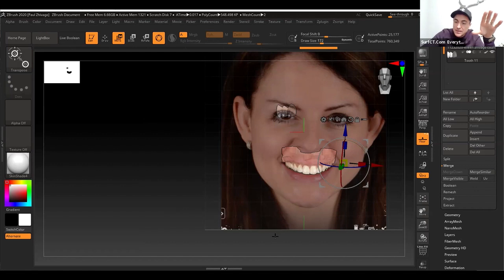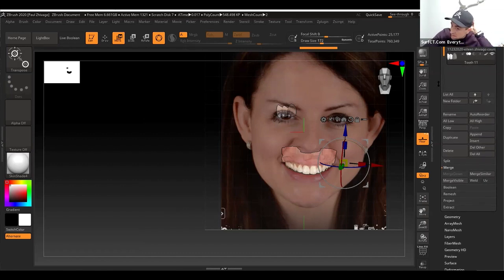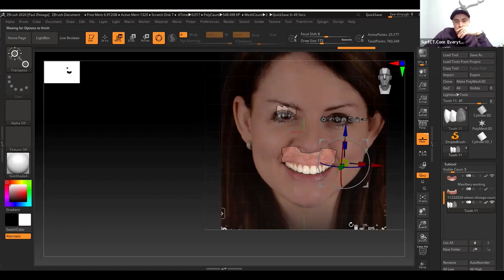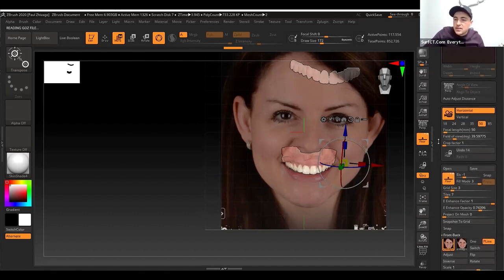So that's another workflow. And let me just import the whole arch here, because I already put them together and connected it as an arch. Let me just do this. Let me see where they are. So it asks me again the same thing, and here's the full arch. So let's look at the arch.